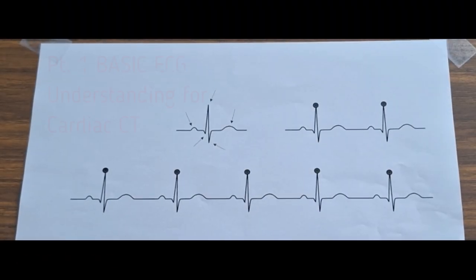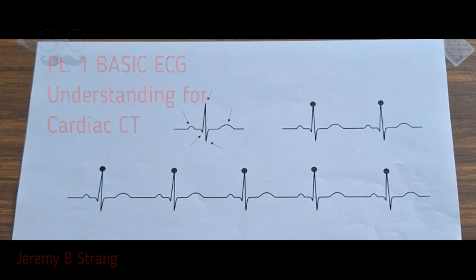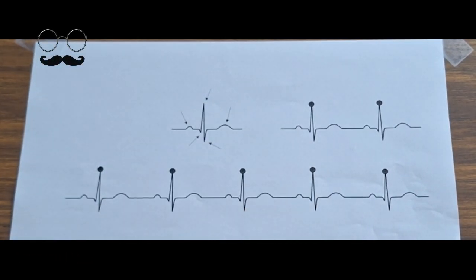Okay, friends, welcome back to another episode of very high-tech interaction here today. We're going to start by being very simple today. So as you can see, right here we have a very simple QRS complex. Let's identify the P, Q, R, S, and T waves.